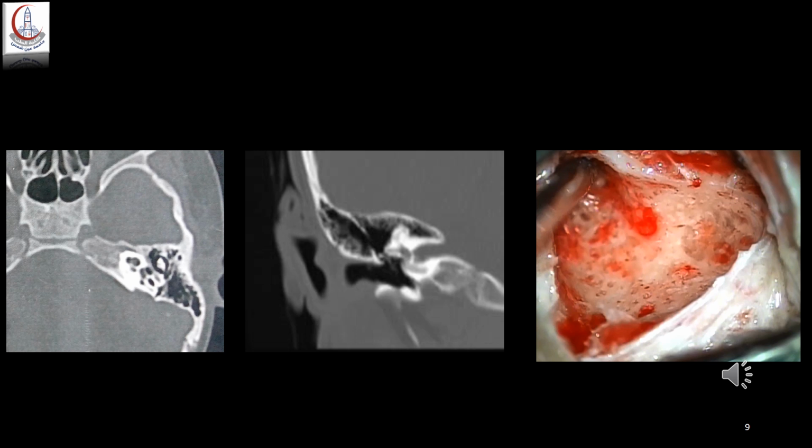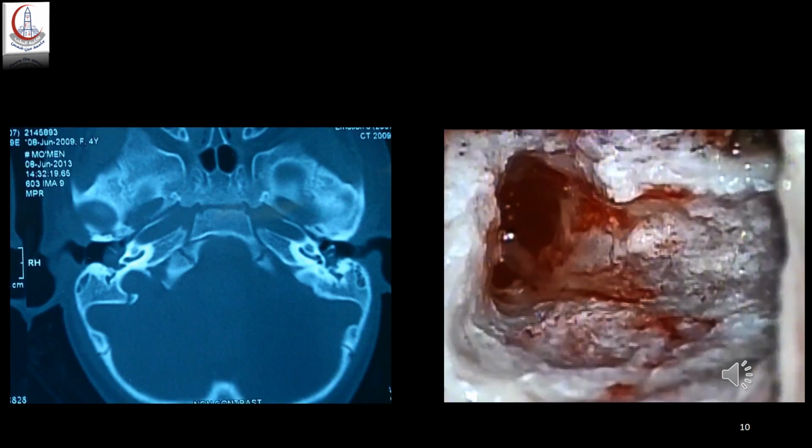This is a well-pneumatized mastoid, and all the dimensions of the mastoid are rather favorable. And in these patients, we expect a simple mastoidectomy to be wide and large, without any problems or anatomical difficulties, which gives us good access to our second step, which is the facial recess approach or posterior tympanotomy, and we do not expect marked difficulties.